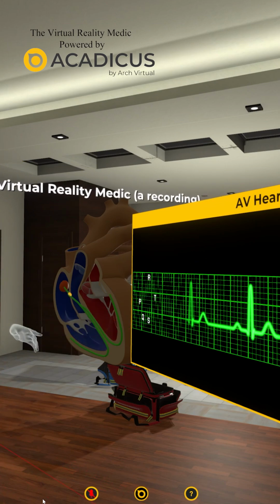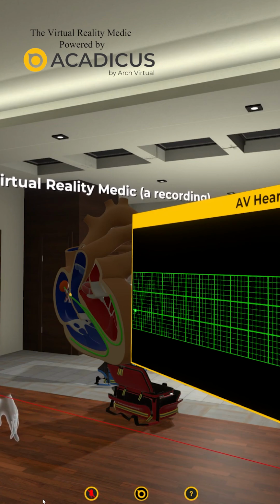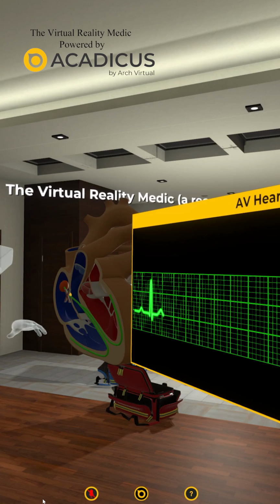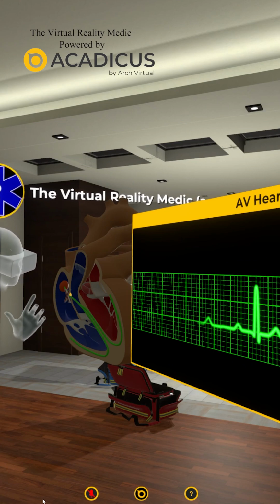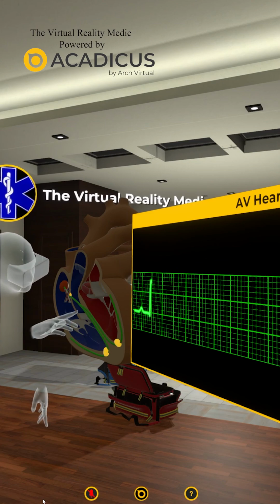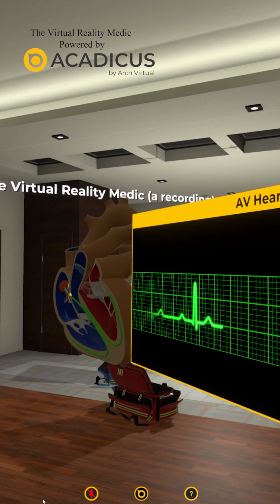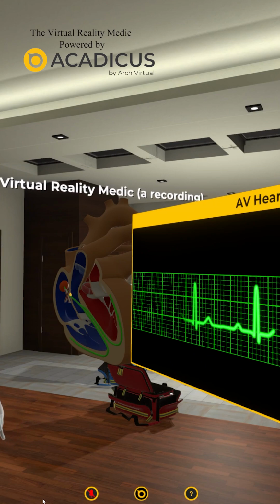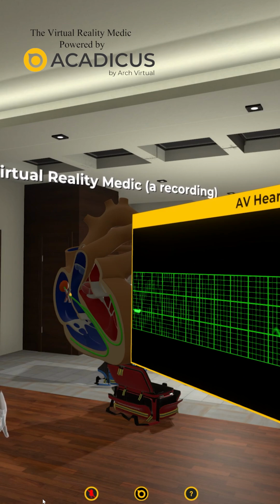All right, well, let's take a look at what's happening when I'm in first degree block. Now watch. This is first degree. So there, see that? The SA node fired, and the AV node kind of delayed just a little bit, but it still went through normally. Went down the bundle branches into the Purkinje network, went normal. All right. Okay, so now let's change that over to second degree type 1.